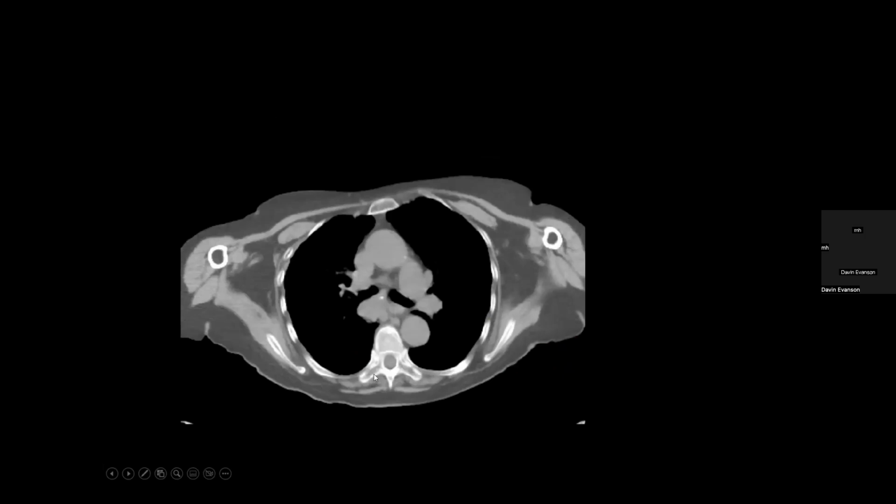We'll end with one case. Here's a patient with a subcarinal mass. This is non-contrast CT. We do the PET. And I should mention, we can actually quantitate how much activity there is, something called the standard uptake value. Here it's 20. A normal value is 2.5. Anything less than 2.5, you say, don't worry about that. And you realize that there are a couple of false negatives, but that's a good rule of thumb.